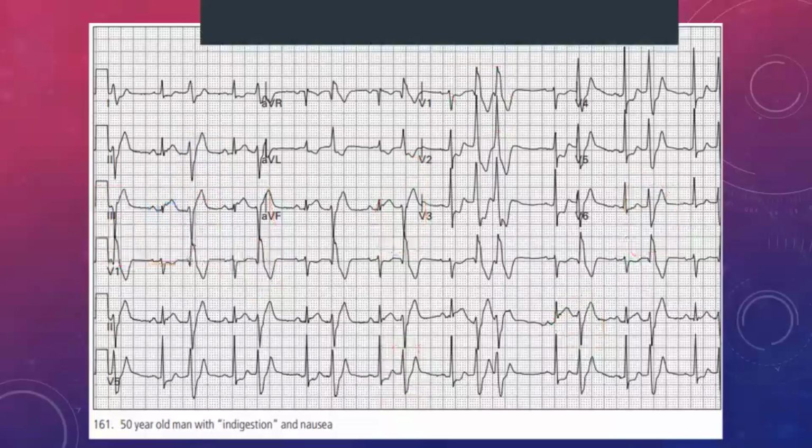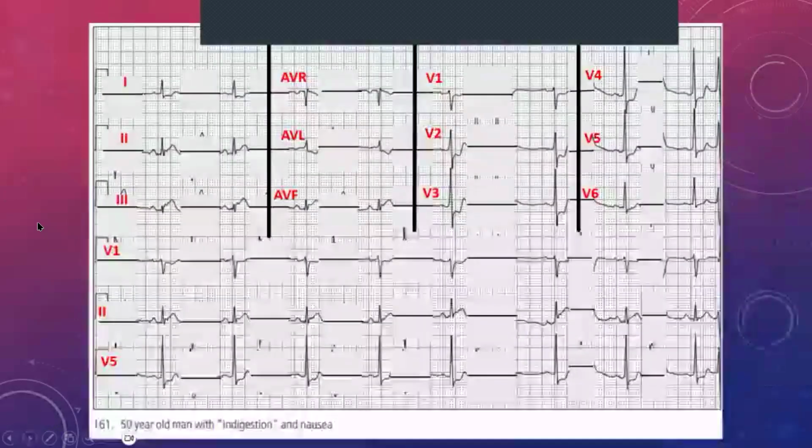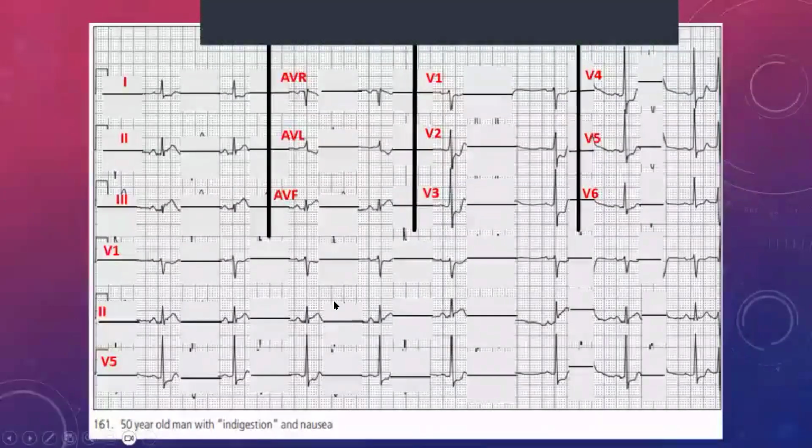And you guys are welcome to try and answer if you can, but I know these are difficult ones, so I'm not going to stress you out if you don't know the answer, but if you can, try and put it in the chat. So I've tried my best to take the exact same ECG that we saw, but I've taken out all of those weird and wonderful looking QRS complexes that we had seen.